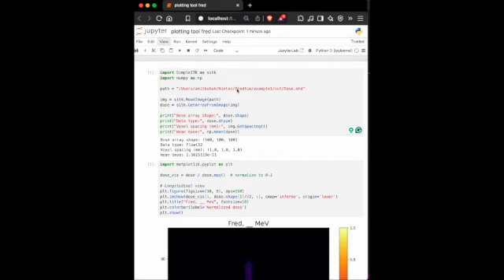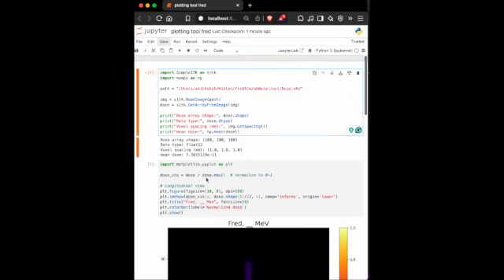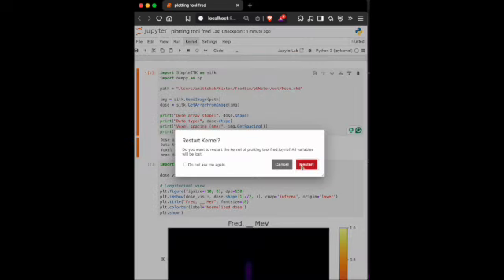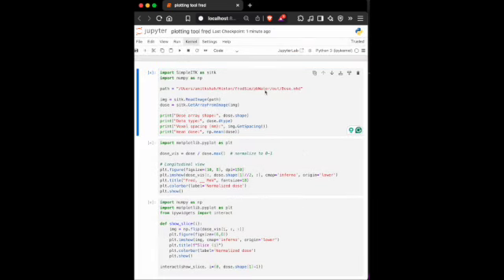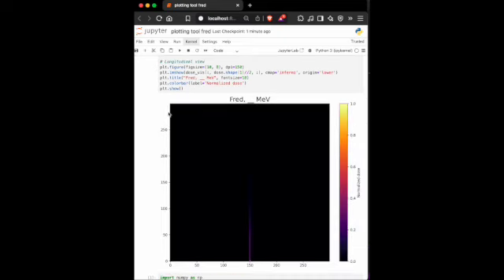For, let's say, 120 MeV, you will see this scale changing. As a result, the beam will appear smaller. Now for this case, it's maybe at 150 MeV, and because 150 MeV has its Bragg peak at a higher depth, you will see the pencil beam to be smaller because the scale changes. You see the scale changed. I hope that was helpful. Thank you.